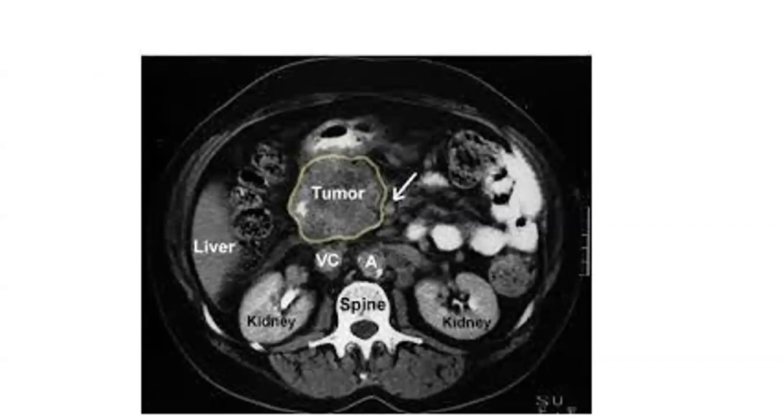And here you can see a tumor carefully outlined. And if you add contrast, this tumor will accumulate contrast in its periphery, and it will show you what's happening to the adjacent structures around it, and also where the blood is flowing in and out of it, okay? Anyone want to speculate what part of the body that tumor's in? Head of the pancreas, yeah. So often they have jaundice, gallbladder obstruction, clay-colored stools because there's no bile getting through, okay?